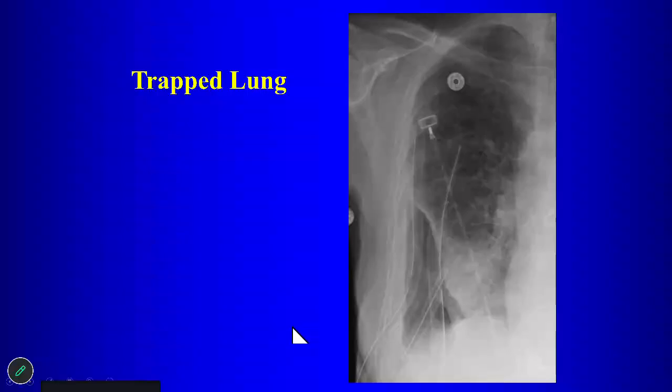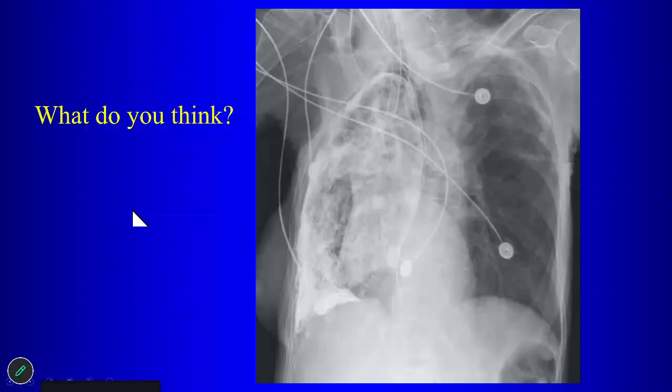So this is a common problem, right? We can see this in anything that causes inflammation of the pleural surface. If the lung does not expand after drainage of collection, we think about a trapped lung. Okay? What's abnormal here? Visceral pleural calcifications. It could also be parietal, but I guess there's extensive pleural calcifications. What do you call this? I'm not sure what you call it, but is it secondary to like a chronic empyema or something? Well, chronic, yeah. If it's one-sided and asymmetric like this, you would think that this is probably from chronic empyema.